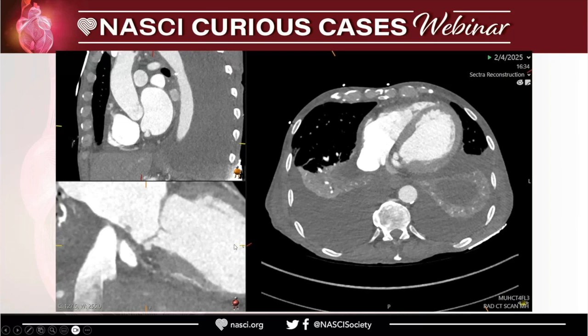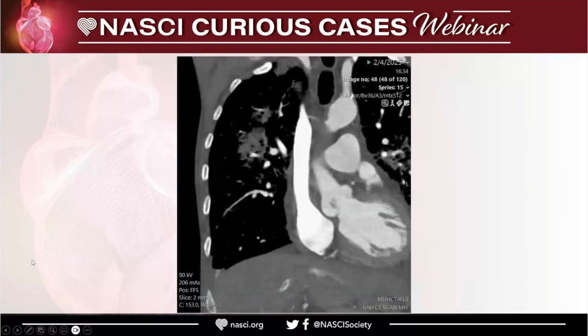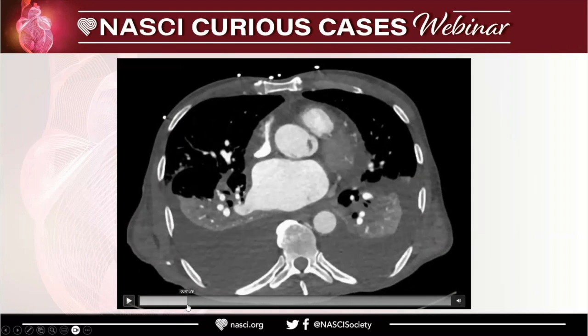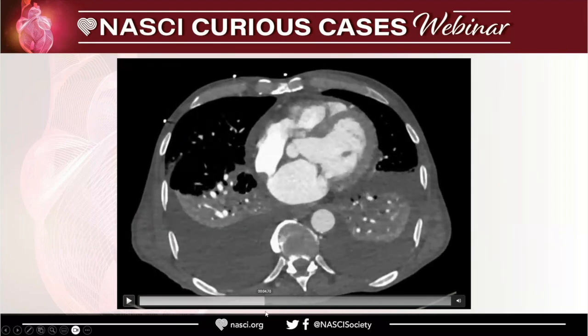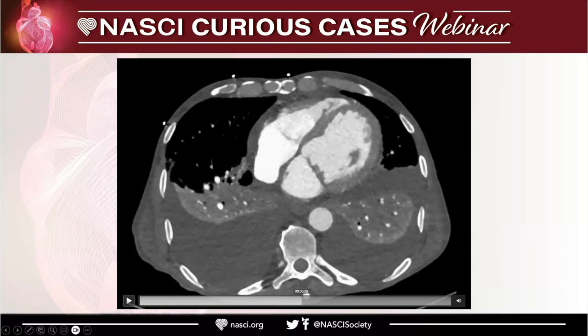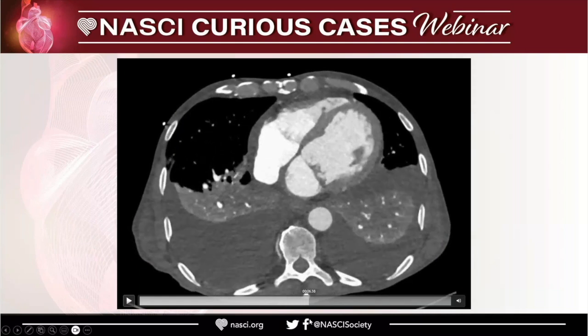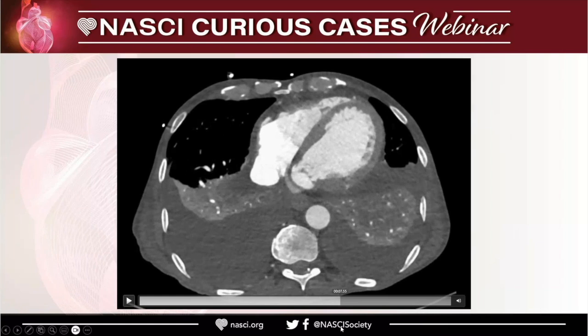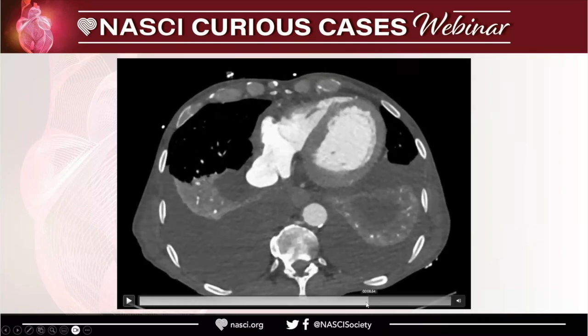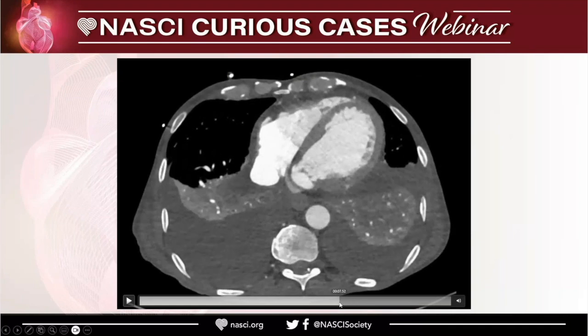But in those cases, if we go back, you can see that your annulus is properly... I do not have a three chamber, of course, that would have been better. So you see that area out there, and you are losing that. In mitral annular disjunction, your annulus should be complete.